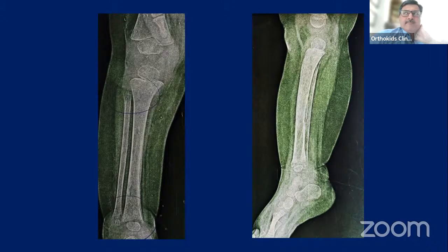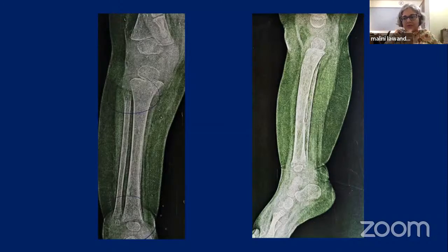Sometimes you may even have metastasis from neuroblastoma or something, metaphyseal lesions. Even the proximal tibia is good. It is only distal tibia and proximal fibula, and the fibula especially looks something aggressive. So just thinking mets from neuroblastoma or something like that, because distal femur looks fine.